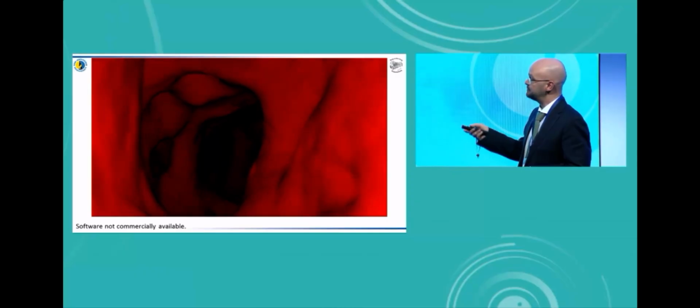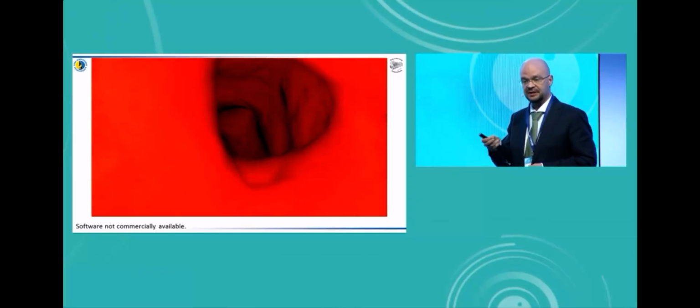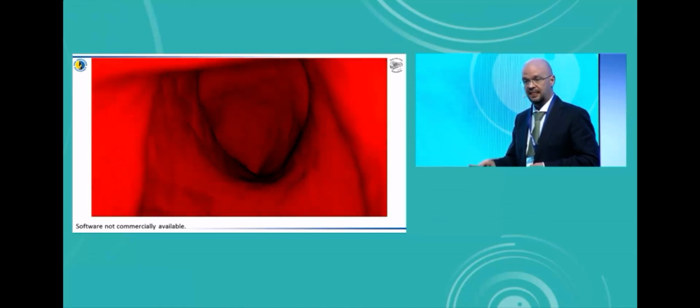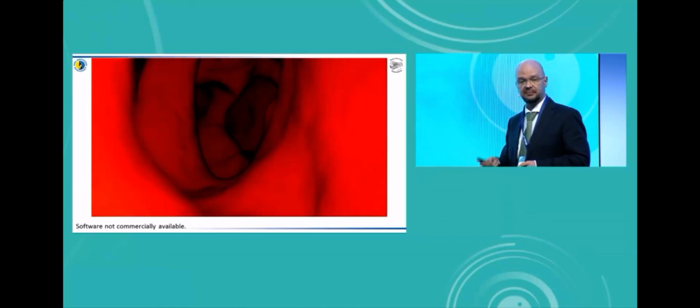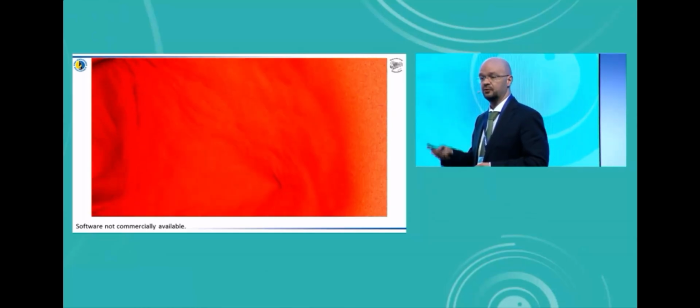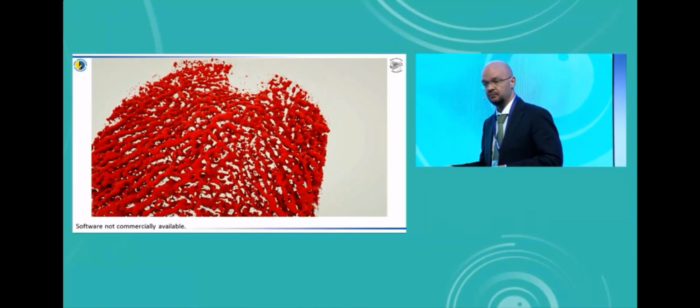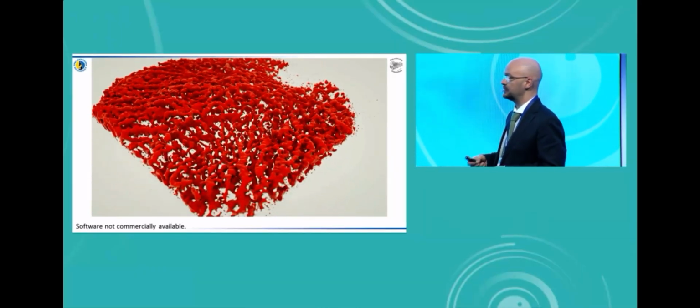But since it is a triangle mesh segmentation, it is possible to give all of these walls mechanical properties inside the simulation engine. That in turn makes it possible to use these kinds of vessels for fluid dynamic simulation. And in the future, using this kind of information for fluid dynamic simulation will help us to measure exact volume. It'll help us understand how the fluid dynamic is changed with different medications and with different diseases.